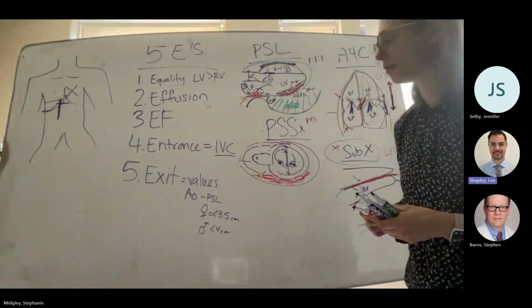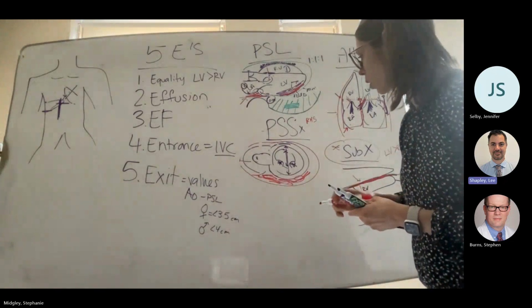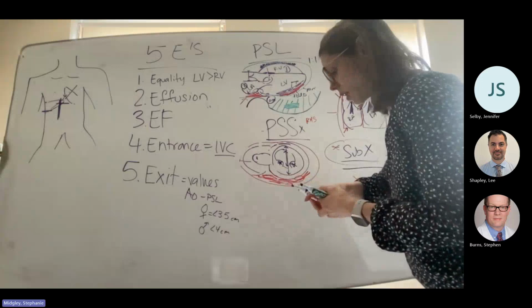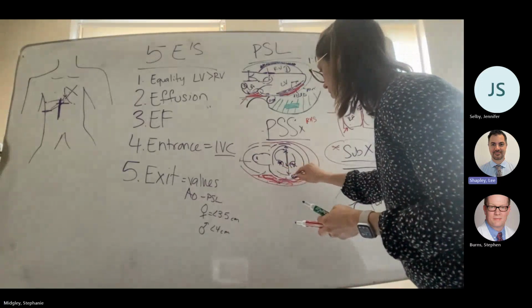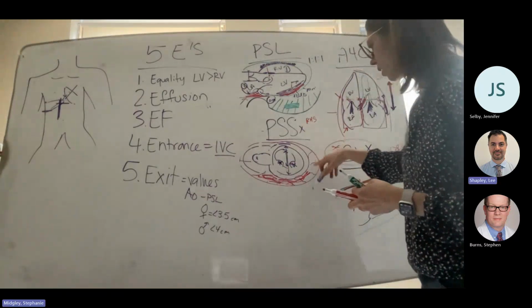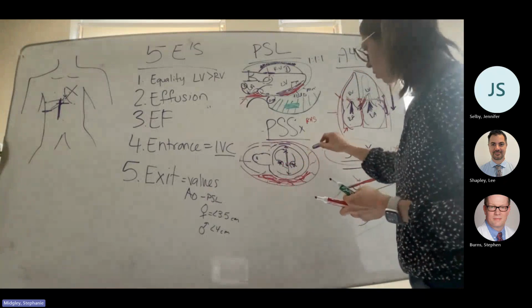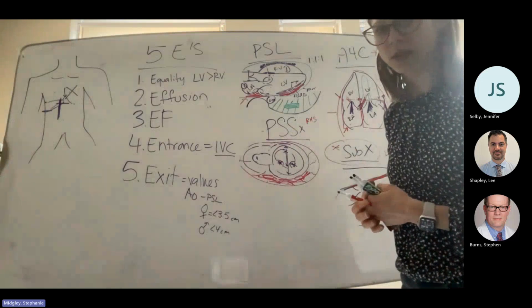And then I just assume if there's a complex pericardial effusion, it's just not going to look the same. Yes, it'll usually be heterogeneous. You'll see septations in there. I had one patient, if I can find the images, she had RA and had an effusion, and she had this weird spider web looking complex pericardial effusion.